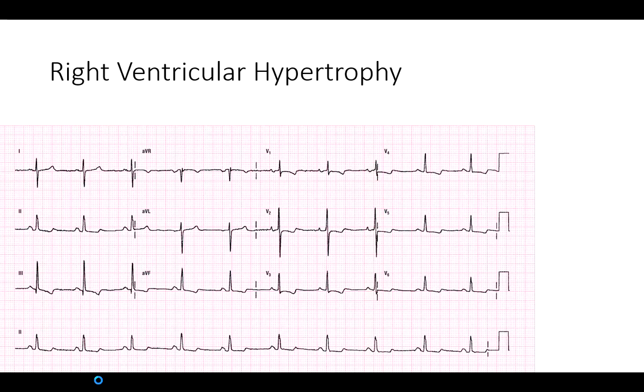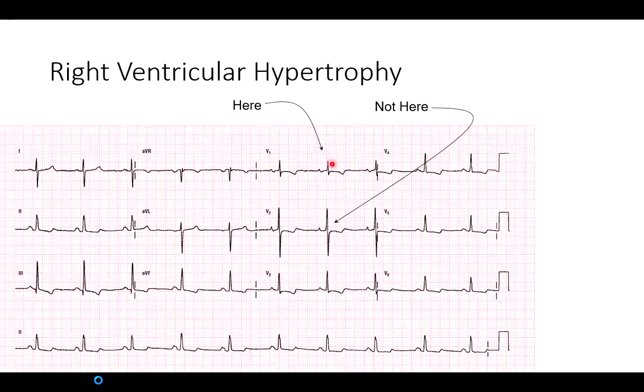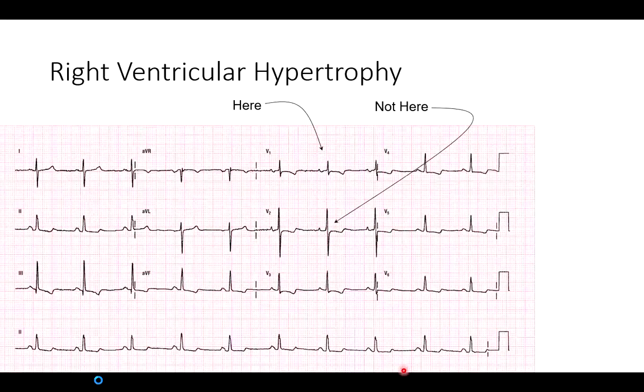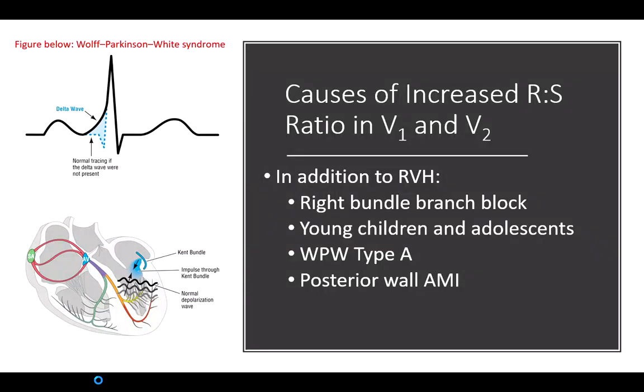Again, let's see, is there an RS ratio, let's say in lead 1, or V1 and V2, that's greater than 1? Yeah, right here. But it doesn't have to happen in both. So this is another thing. We need to consider our criteria, and we say it doesn't have to have all the criteria from lead 1, V1 and V2, but in this case, V1 certainly has an RS ratio greater than 1. Now, there's also flipped T waves associated with some of that strain pattern, concave, so I might be looking at some other consistent variables on this particular ECG consistent with right ventricular strain.